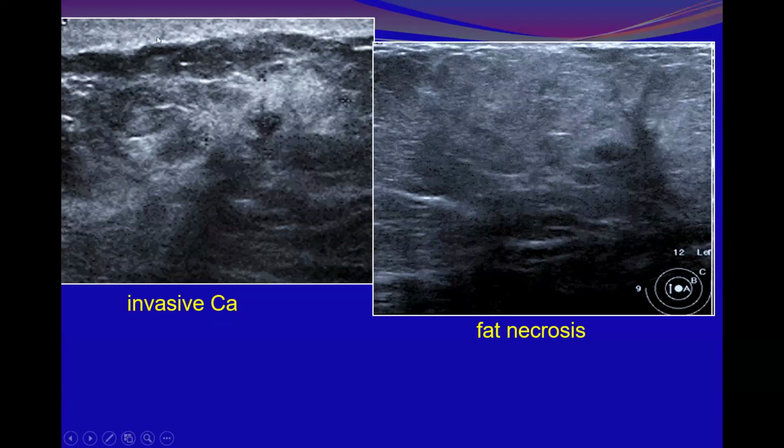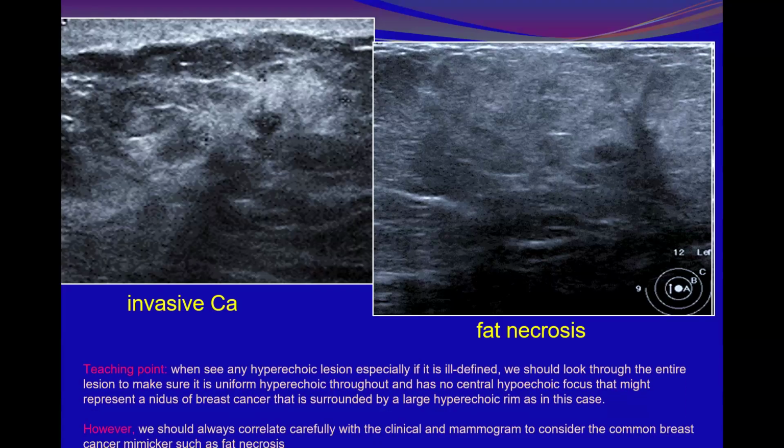And even here, the presence of skin reactions without underlying remarkable inflammatory hyperemia will make it more suspicious and can upgrade it to BI-RADS 5 here. But here at least it will be BI-RADS 4C until proven otherwise, unless there are corresponding mammographic findings or MRI features suggesting this is fat necrosis. It will be BI-RADS 4C and for biopsy and pathology diagnosis.